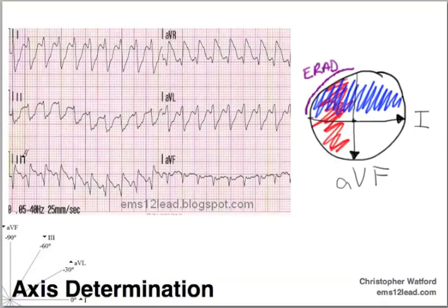We should never come across this. And there's a couple causes of this: pure ventricular activation or limb lead misplacement. If this was a normal looking rhythm, I would probably hunt to find whether or not I've placed a limb lead on incorrectly. Due to this being a wide tachycardic rate, we can be somewhat safe to assume that this is pure ventricular in origin.